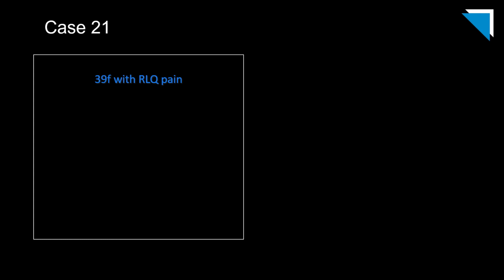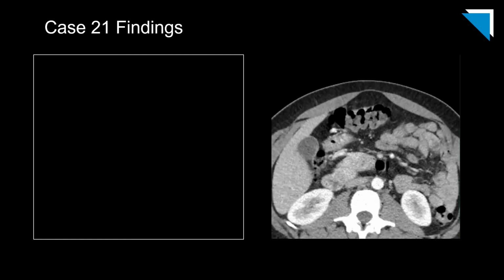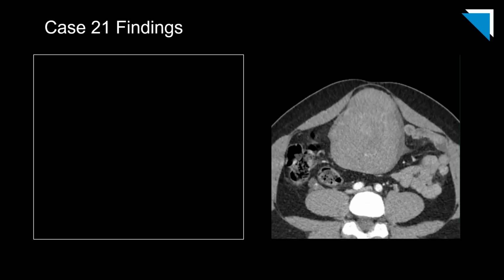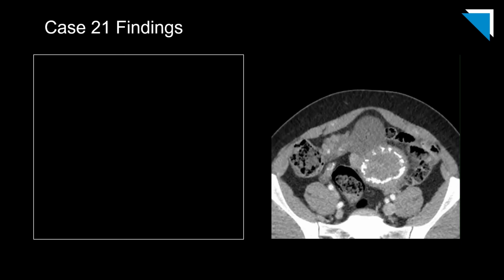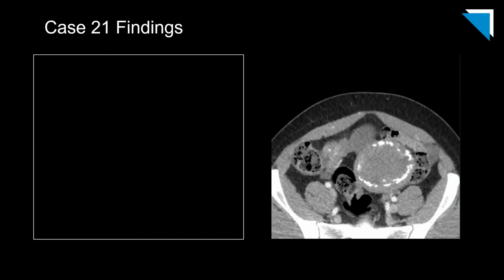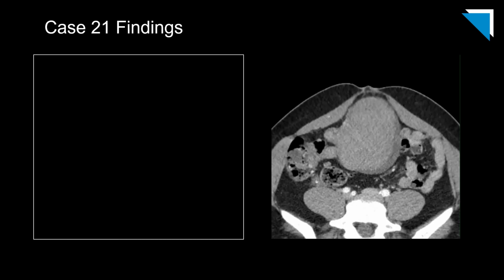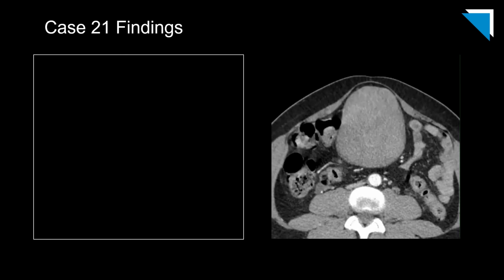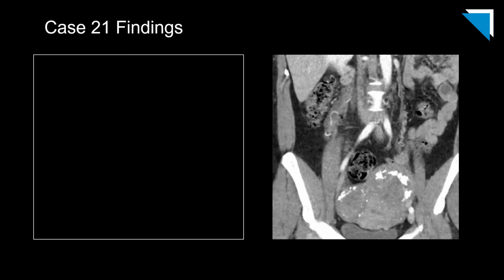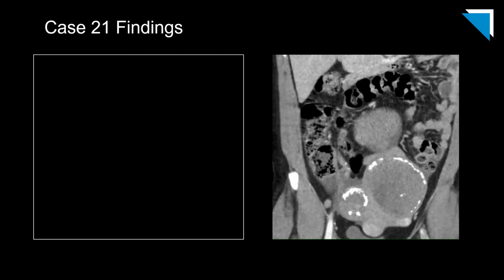Here is a companion case of a 39-year-old woman with right lower quadrant pain. Let's scroll together through these axial images from a contrast-enhanced CT scan. Here are the coronal images from the same study.